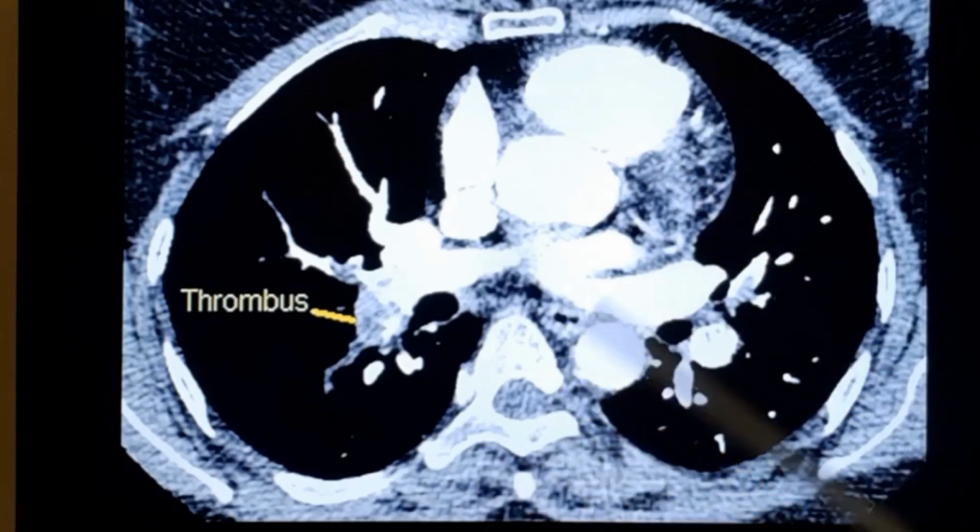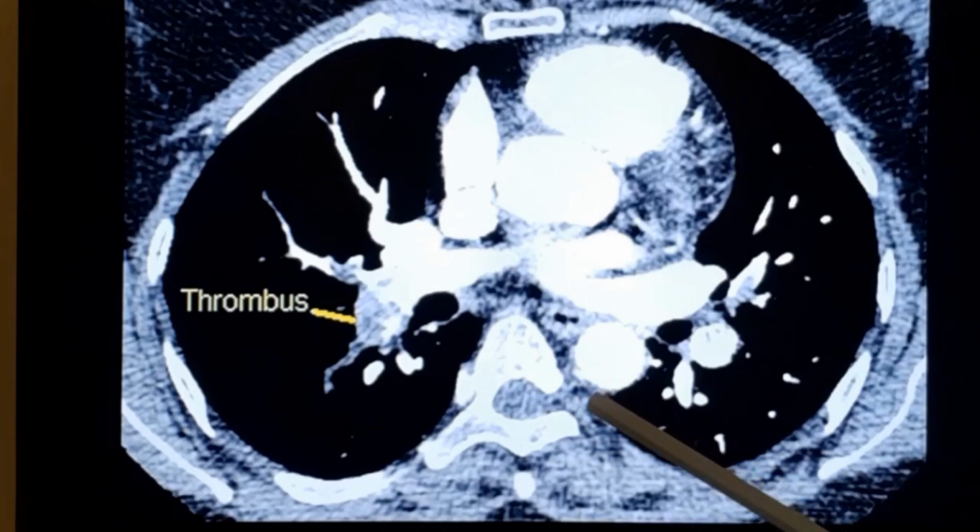At the bedside, you may do an echocardiogram to assess right ventricular and right atrial sizes as well as the pulmonary artery pressures, especially since CT takes time to arrange.